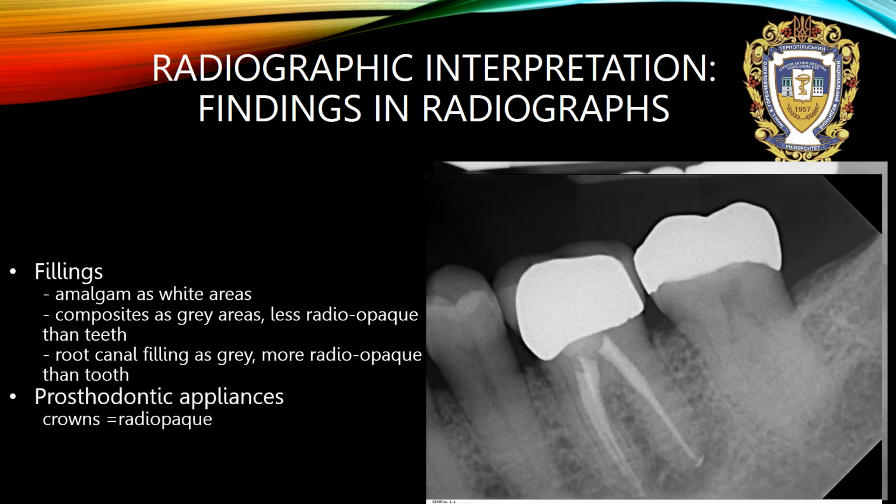Metal ceramic crowns look like here, or zirconium or metal crowns look like here. But plastic or non-metal ceramics look like here.